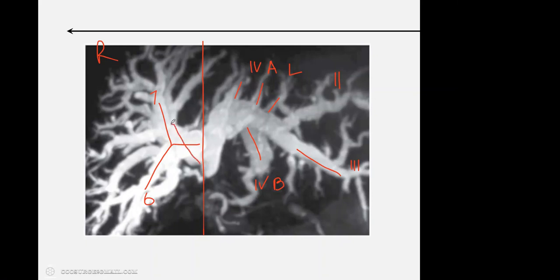Here these are superimposed images, so you may not define it very clearly, but for my discussion, let's assume that this is the right anterior sectoral duct, and it is going to segment 8 like this and segment 5 like this. Usually 7 and 6 occupy the lateral aspect.